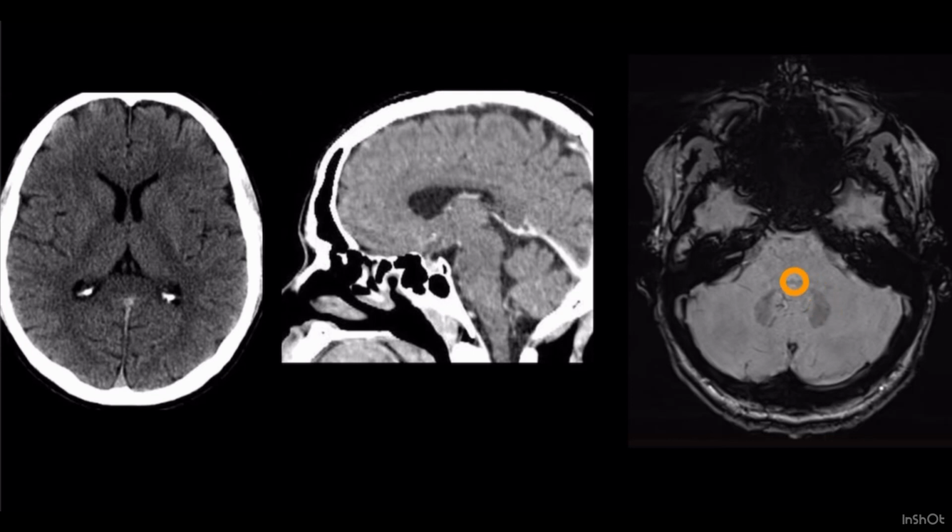You can appreciate this gray curved semi-lunar structure on either side of the superior aspect of the fourth ventricle. These are posterolateral, curved structures of gray matter nucleus, and this is also a common site.